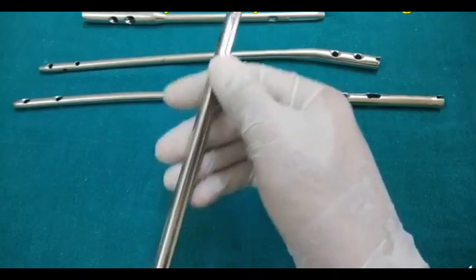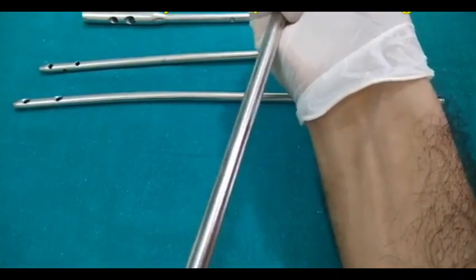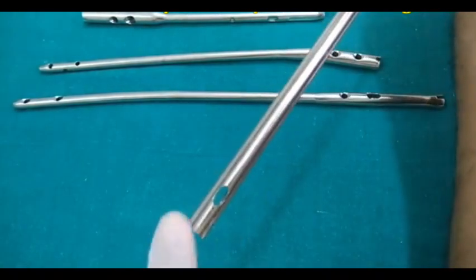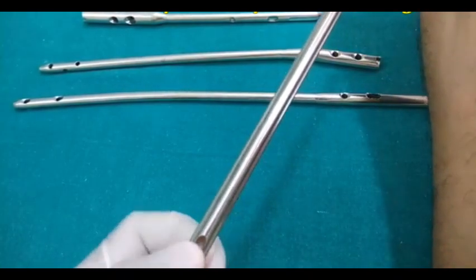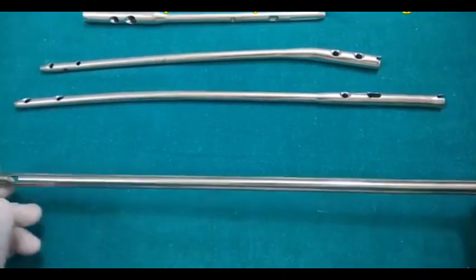So this eye goes into the proximal fragment bone, and now it got stuck. It is not progressing further. So in order to remove this nail now, this eye will be helpful, because through this eye you can extract it again. So this is the purpose of the 2 eyes at the 2 ends.